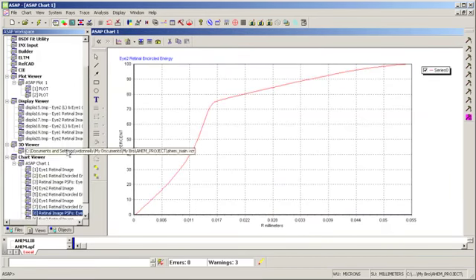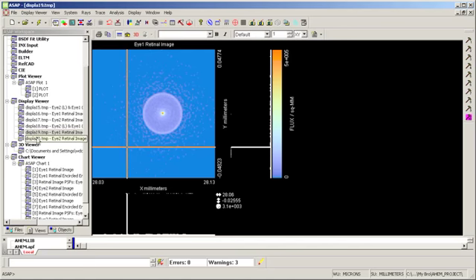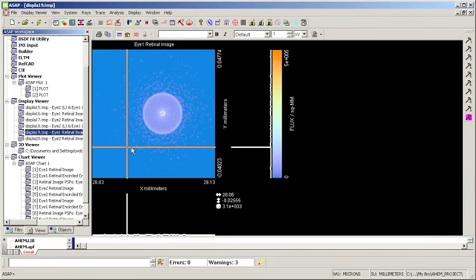So I get some additional graphics when I use 2 eyes. I get a point spread function, and you can see that there's a certain amount of shift off the center of the retinal window that I selected because the eye has rotated 1.5 degrees. So we actually see that showing up here in the retinal image window. And we also see it for eye 2. It's just gone the other way because eye 2 is rotating inward and eye 1 is rotating inward. So you'll see them go outward.